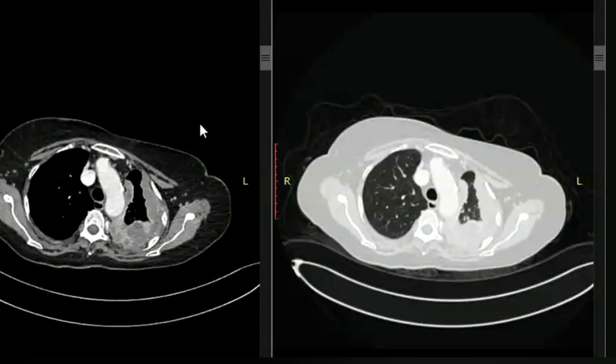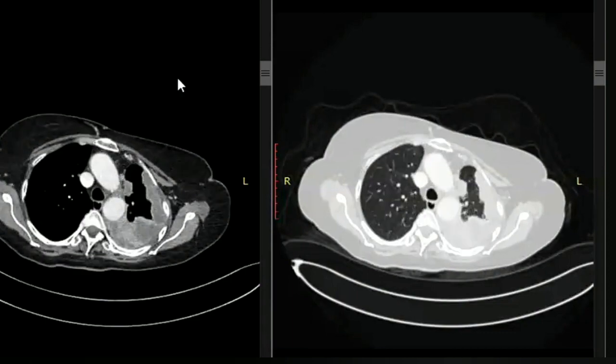I've just split it into 2 so that other candidates can have a look at the lung window as well. But the candidate who is sitting on the hot seat, just review the mediastinal window and later on you can review the lung window. Okay, ma'am.